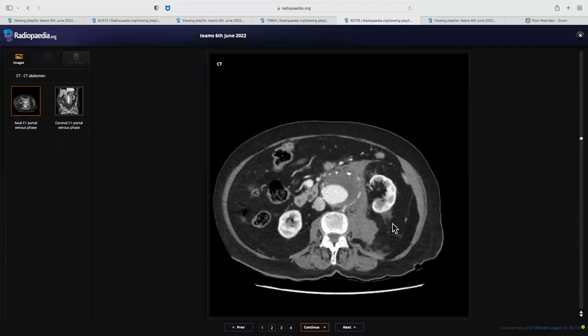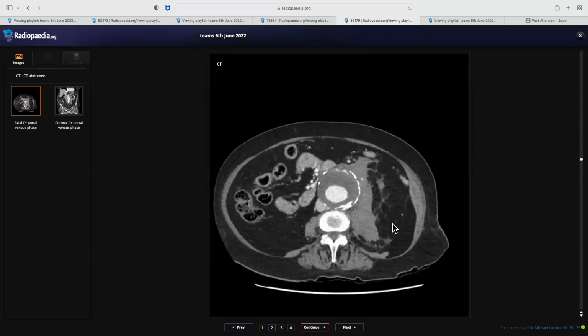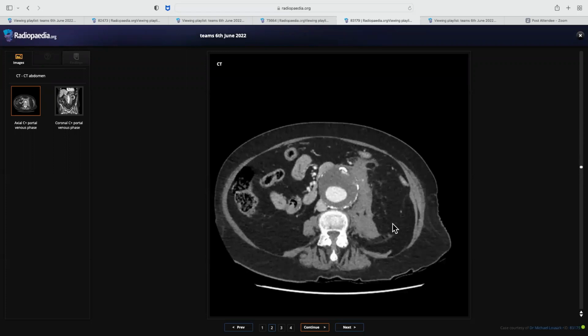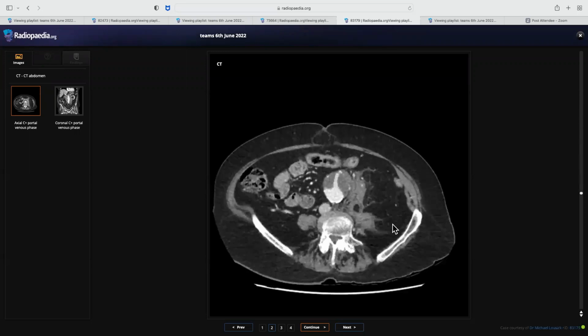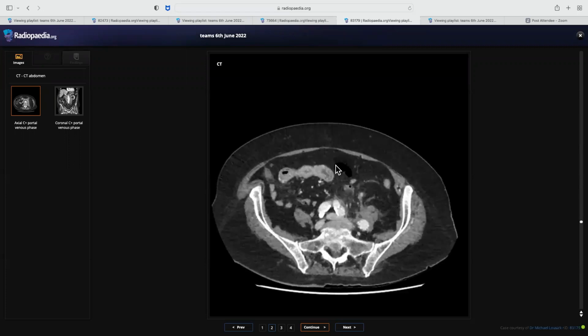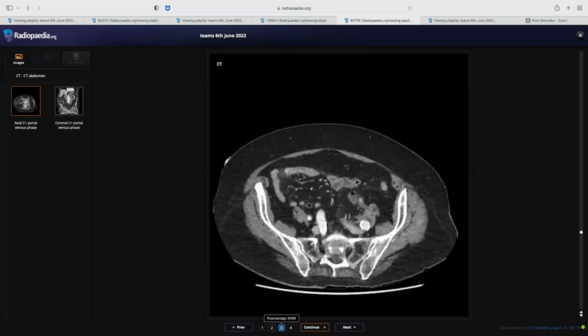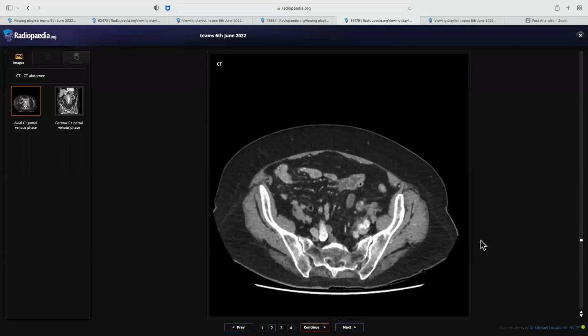And I can see some enhancement. Okay, so how are these patients managed? This is a leaking abdominal aneurysm. I will contact the referring clinician, and the patient needs immediate referral to the vascular surgery and interventional radiology team for management. Okay, so we'll go to the next.